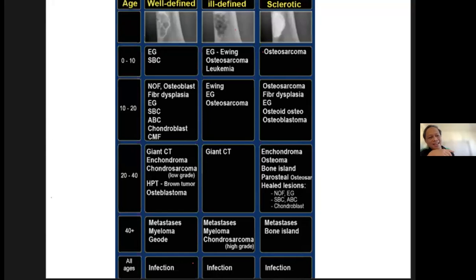Both are benign lesions, mind you. Sometimes they come up when there is a pathologic fracture. When the bone expands, it becomes inherently weakened, so a lot of times the pathologic fracture is what leads you to discover these aneurysmal lesions. I'll look into that in more detail and attach it to the TG group. Is that okay with you, Pandi?